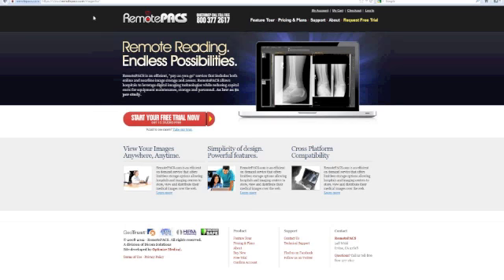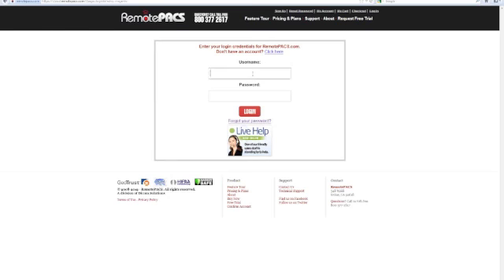So I think that most of you already use RemotePACS, or you work with a facility that does. So the intent of this web demo is really to give you guys an idea of how RemotePACS works and how you guys can get the most out of the features that we offer in every single account that we have. I'm going to begin here by going to the login section right here, and I'm going to log in to our Dicom demo account.